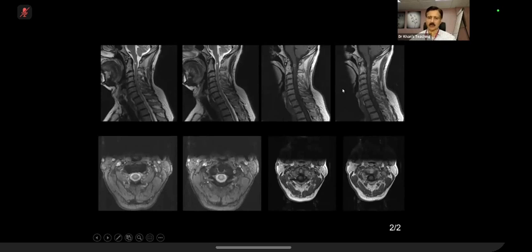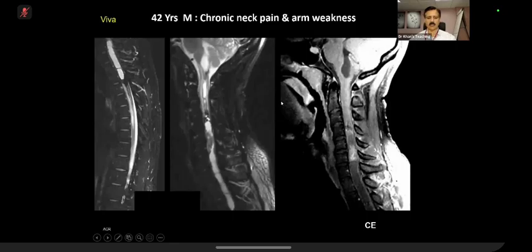They can have a cystic component at times, a very, very long segment cystic component. So here, the top differential will be a tumor. And the tumor, as in the first case which you saw, astrocytoma will be up there. And ependymoma less likely or unlikely because of lack of hemorrhage, as you pointed out in the previous case. Okay, over to you once again.